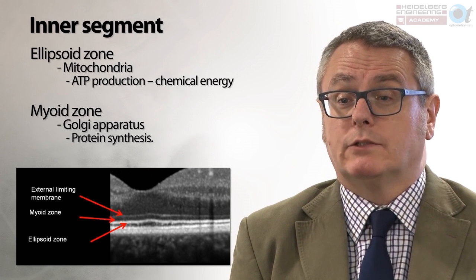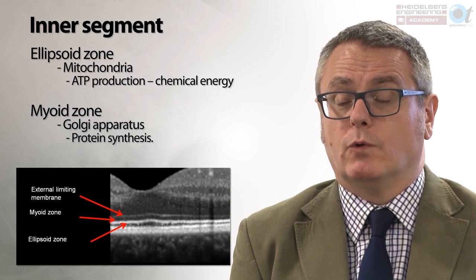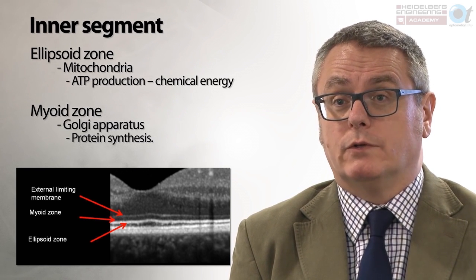Again, disruption of the external limiting membrane can also have a significant impact on the patient's vision. So it's also always important to comment on those structures.